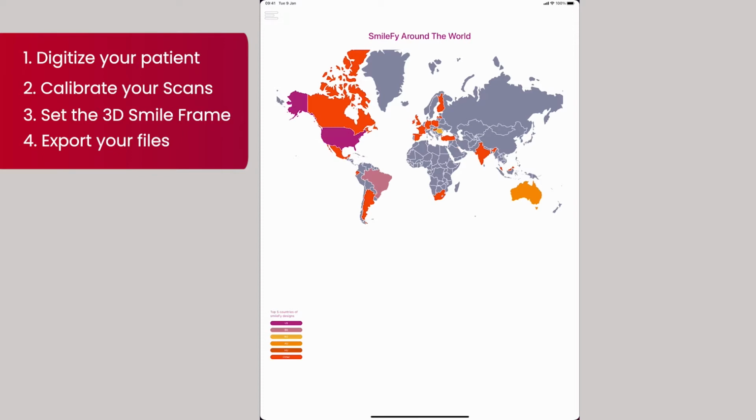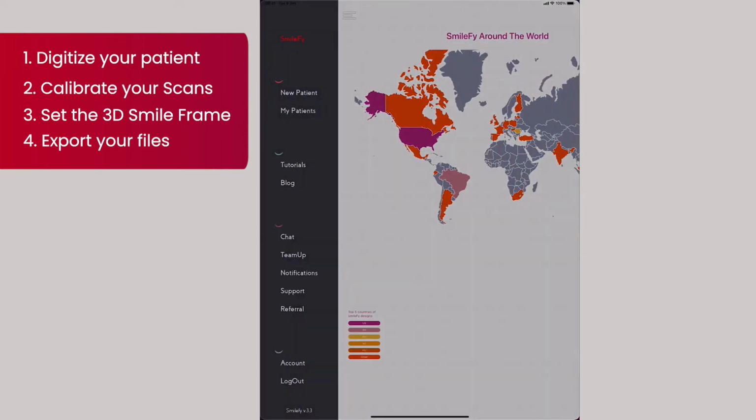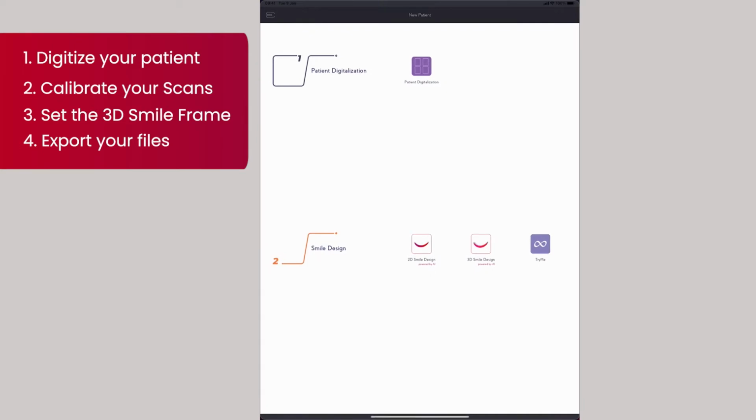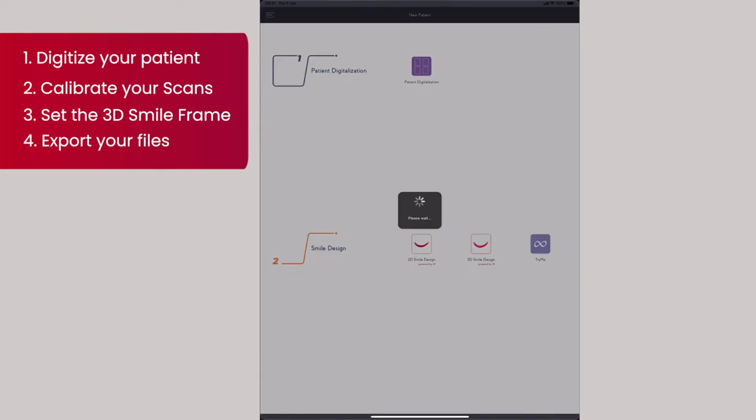Open your Smilefy app on your preferred device and select the menu on the top left corner. Select New Patient and let's start with the first step, Patient Digitalization.